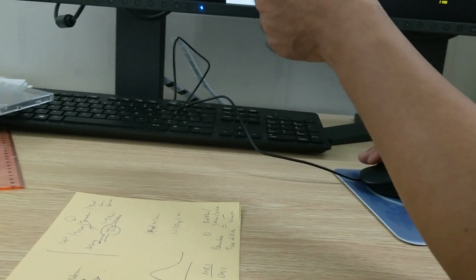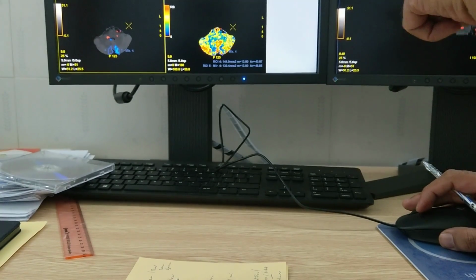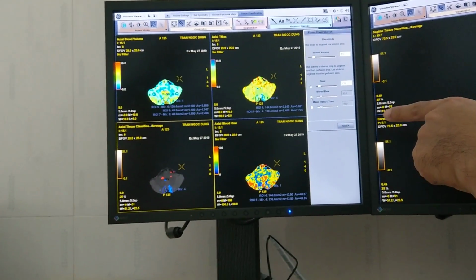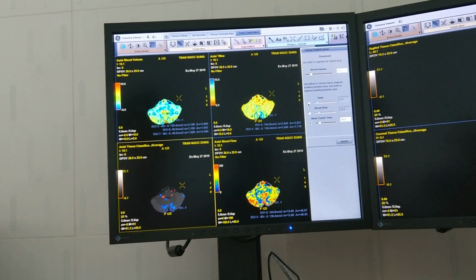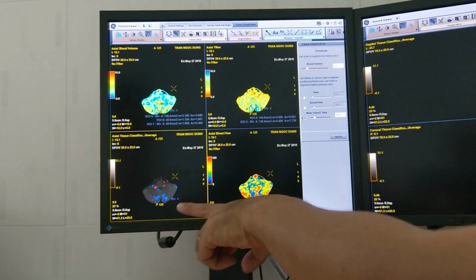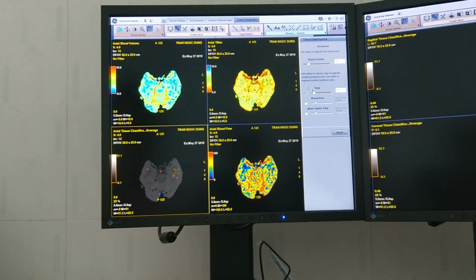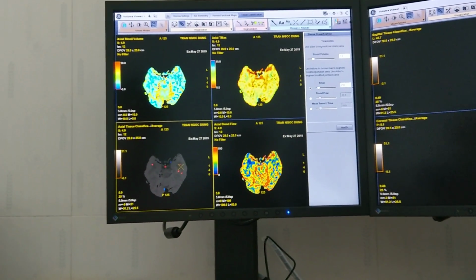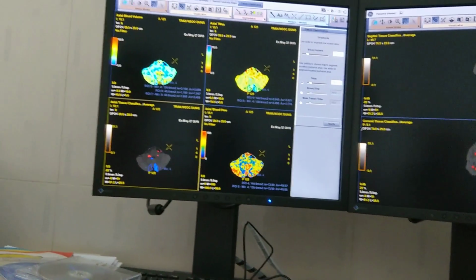Okay, so this one I cannot see because it's not a problem. For example, you have blood volume and Tmax, and go next. Right? You can use either one. You can use blood flow, nothing, right? But MTT. But for GE we use Tmax. In others they probably use mean transit time. So you can see there is a difference, right? Yes. So we use the default only. And this can be changed also. It depends on you. You have to look at it. Then go to next.